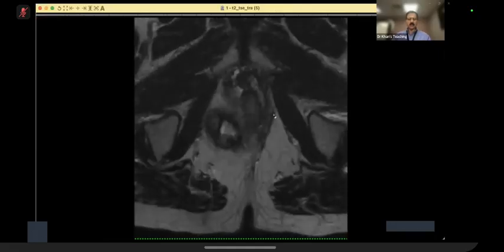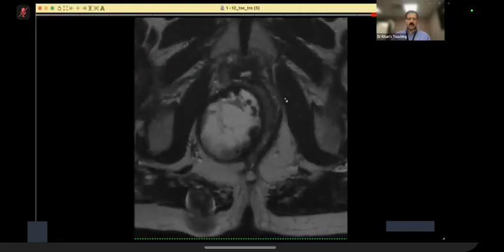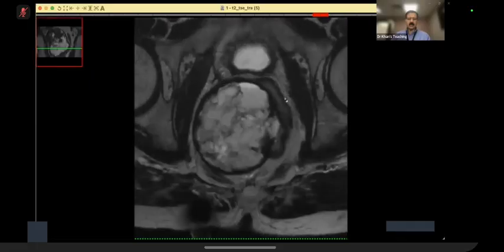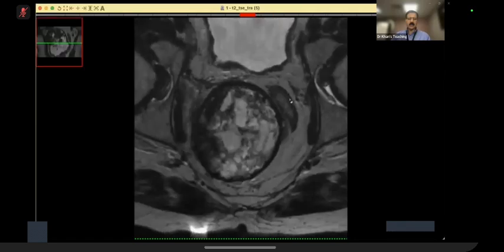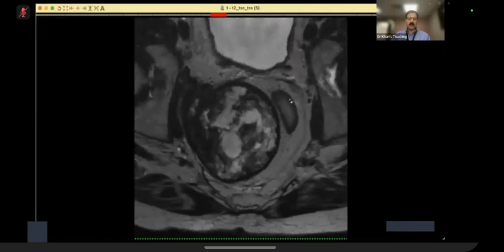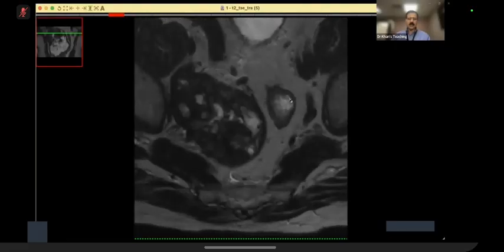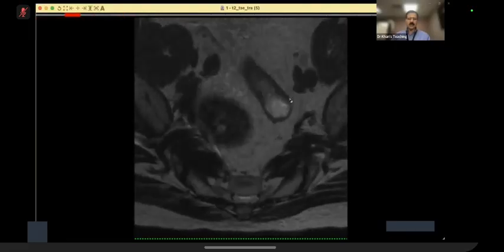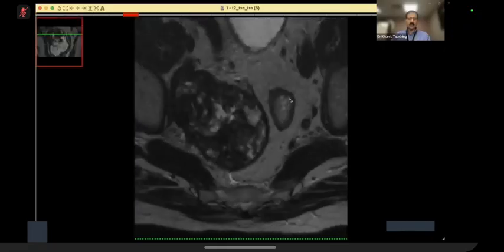These were the clinical notes, and they asked for an MR. I am scrolling for you. Let me scroll up and down, and then you can give me your initial impression. So I've gone up. Now I'm coming down once again.